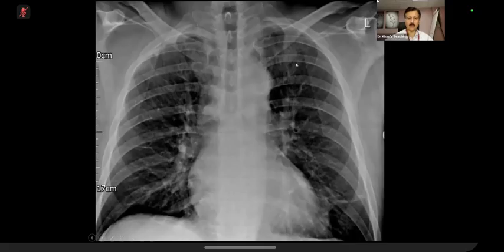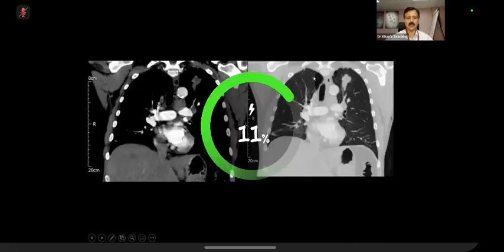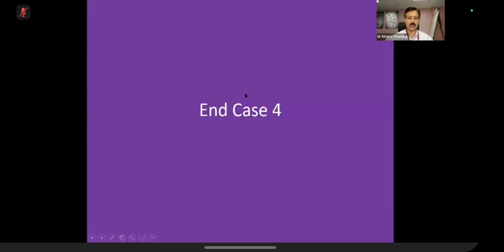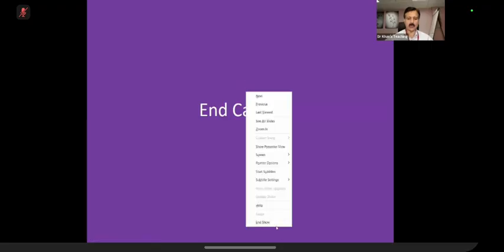Luckily, the patient did not suffer, because after 2 weeks, the scanning picked it up. But having said that, this is a nodule, and this per se is a FRCR case. It can come in the Viva, it can come in the rapid reporting. And this is a CT to make the point. Okay, thank you, candidate 1, and I'm going to candidate 2 now.